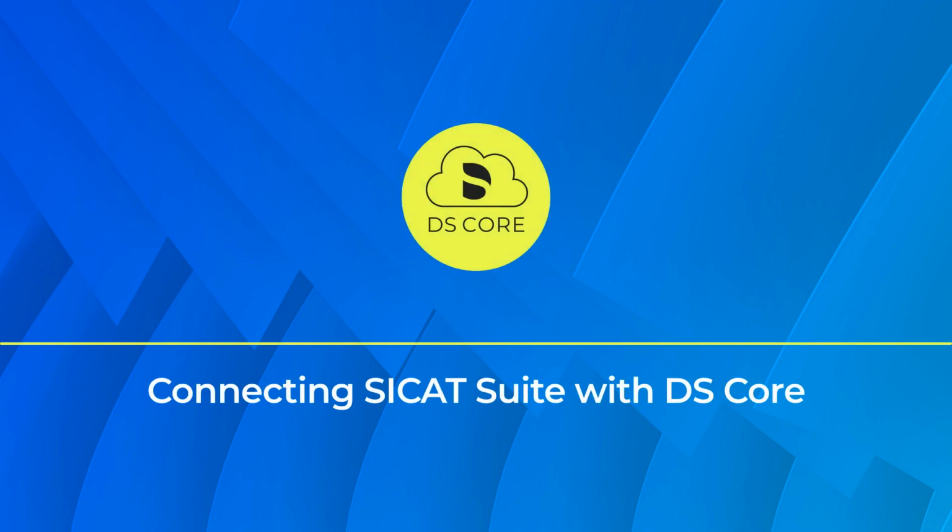In this tutorial, you learn how to set up and use the SICAT connected with DS Core workflow, so you can move through implant planning with faster access to your patient data and keep every file you need in one central digital location. Let's get started.